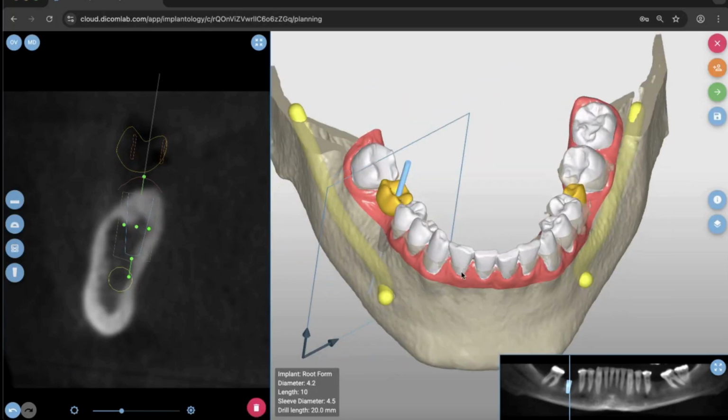Okay, and let's go through some other interesting features of the software, which is different to the previous one. We also integrated a measurement tool. If I click on that, then with one click and another click, I can very simply measure distances. It's super useful if, for example, I want to measure anything related to my treatment plan. I can also make screenshots like this. It stays there. And the other tool which came back is the angle measurement tool.